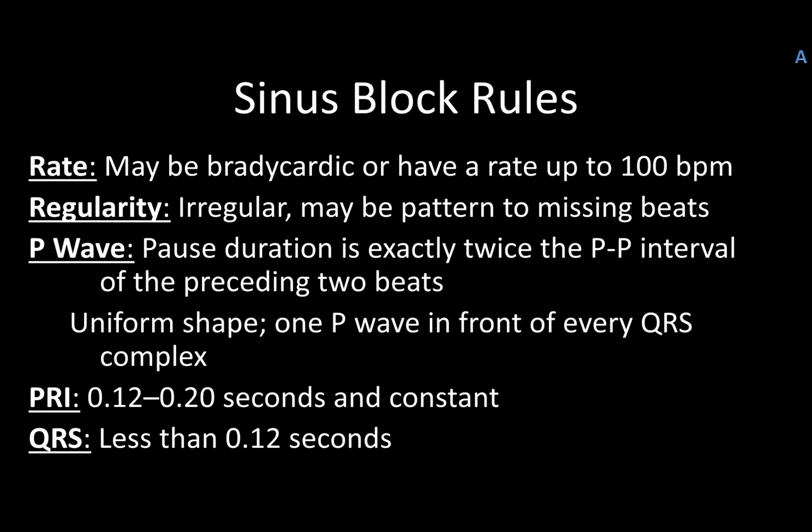The rules aren't terribly challenging for sinus block. The rate may be bradycardic, or it can be up to a higher speed like 100. What really matters is that it's going to be irregular. There may be a pattern that occurs with the missing beats. Oftentimes, this may not be just a single dropped beat. It could be happening fairly frequently to the point where it makes the patient symptomatic, and that's why we focus on it, and it matters.